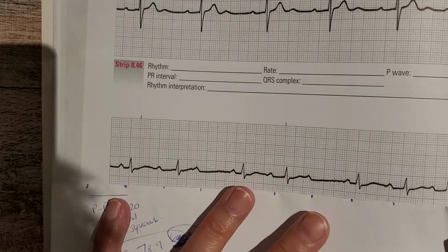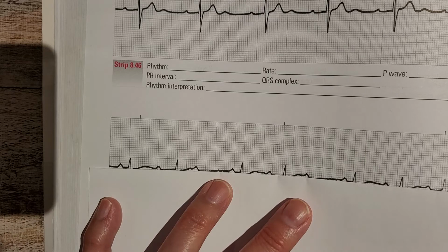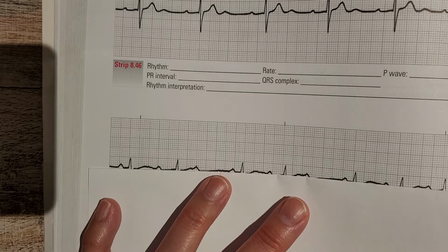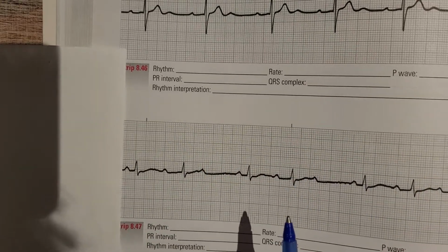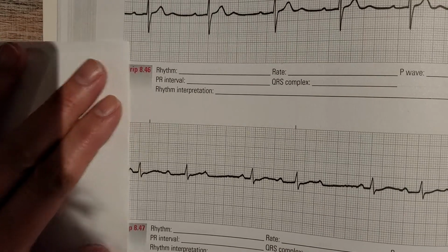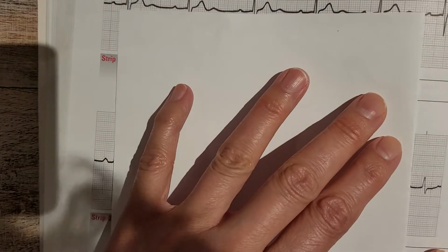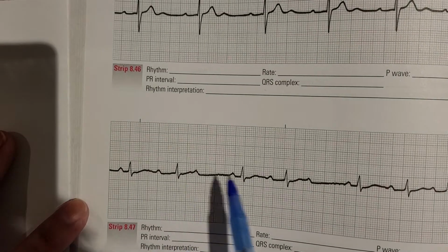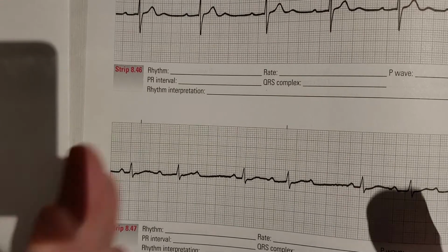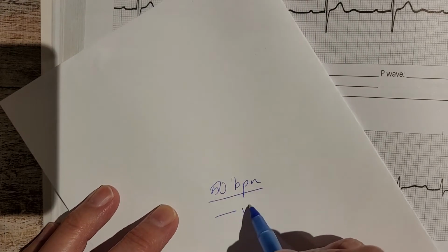Now, for the ventricular rate, we said this was irregular. When we have an irregular rhythm, we count the number of QRS complexes included in the 6-second strip and then determine the heart rate with a rapid rate calculation. Here are the markings for 3 seconds here and here. I'm going to count all the complexes within the 3-second strip. This guy's out if I line it up, so I have 1, 2, 3, 4, 5. If I check the last one, this QRS complex is also out. So 1, 2, 3, 4, 5: 5 complexes in 6 seconds, times 10, is 50 beats per minute. That's your ventricular rate.